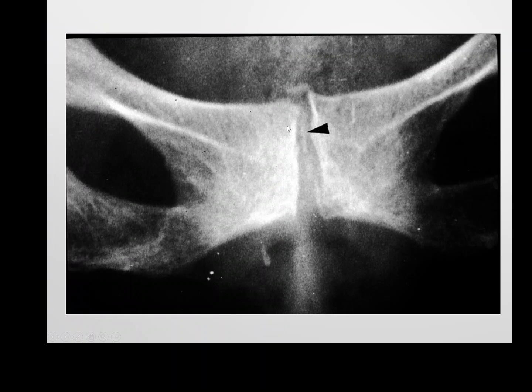And again, ignoring the great big arrow that gives the game away, here you've got that vertical layer of quite roughened appearance, almost like a shaggy appearance of calcium being deposited within the fibrocartilage of the symphysis pubis. So obviously this will also cause joint pain, swelling. You've got some subchondral sclerosis on this particular image as well, so it's looking quite bright, quite dense around here. So again, there's your giveaway that it's not simply arthritis, this is calcium deposition. So there's your CPPD.